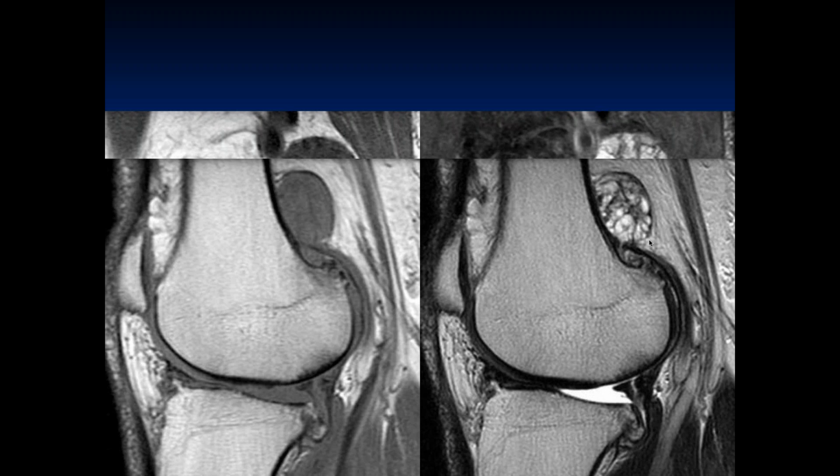It's along the posterior aspect of the medial femoral condyle in the area of the gastrocnemius tendon. So this kind of complex cystic collection may represent a type of ganglion extending in the area. So this is another common area for a benign ganglion cyst. And notice that the margins are relatively sharply defined. We have no periosteal reaction here.